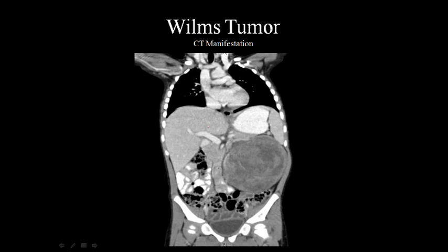Okay, this one kind of gives you a really good indication of a palpable abdominal mass. Notice how the abdominal wall is all nice and smooth here, and then on this side comes down and then goes out and goes back in. This would be palpable.